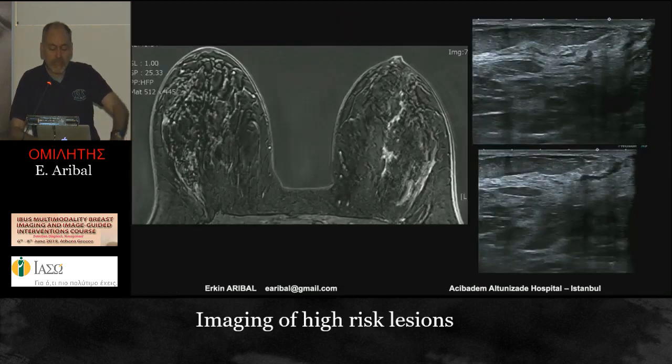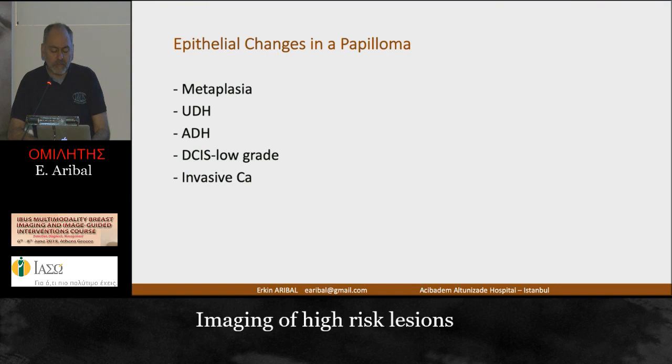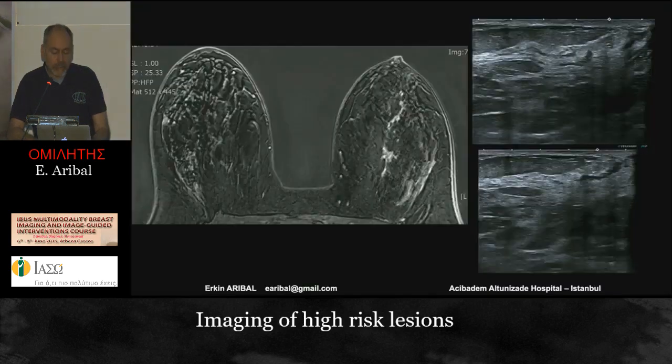Another case, again, here you see a linear contrast enhancement. It looks like multiple papillomas and peripheral localization. This is the ultrasound finding of the patient.